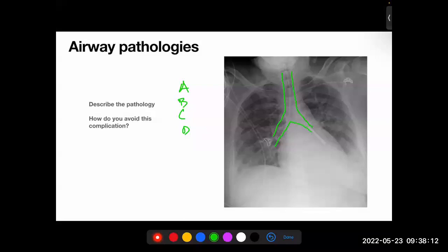Then that is the airway. Then in terms of the cardiac, in terms of the lungs, there is some opacification down here. The costophrenic angles are not very clear. The heart is also a bit enlarged. There are all these lines. These are instrumentation. This might be an ECG thing. This might be a central line. We don't know. But are you seeing this thing here?